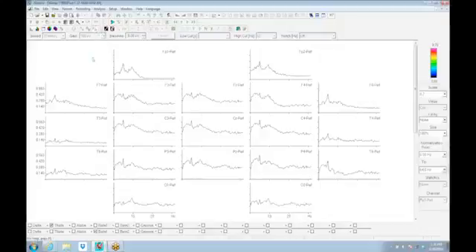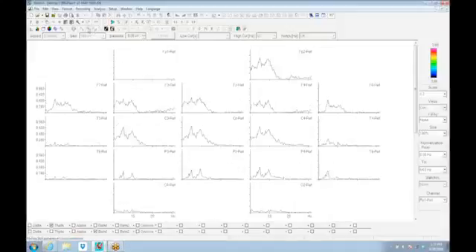Can you explain, you're saying coherence, for example, at FP1, that's where you had your crosshairs. What is it comparing it to? What is the coherence to? This is the average coherence compared to all other sites. I see. If you want to do pairwise coherences, that is back here. FP1 to itself is, in fact, an identity, so it doesn't show. But you can select an electrode and how it's coherent to anything else ends up being seen here.